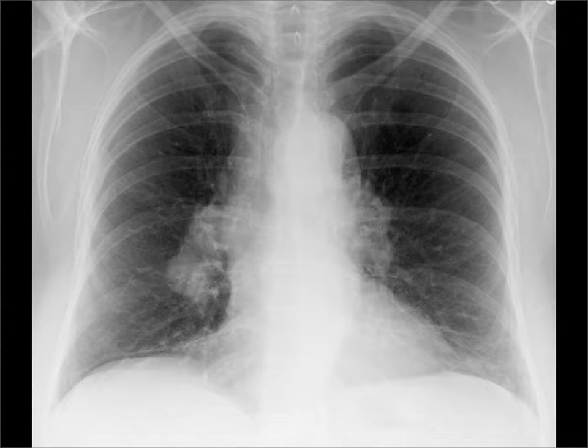We have lots of lymph nodes in our hilar, and they can get kind of difficult to look at on the frontal radiograph. Old films are definitely our friend here. And looking at the lateral chest x-ray and seeing it look totally normal there can be helpful, but this patient has bilateral hilar adenopathy from sarcoidosis.